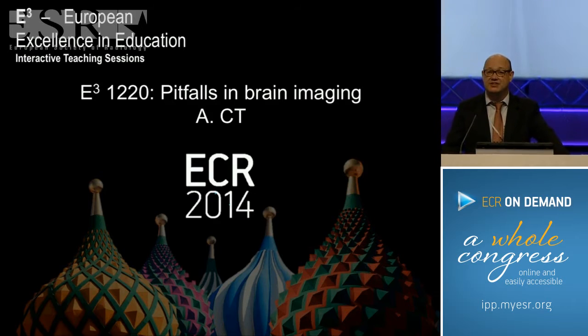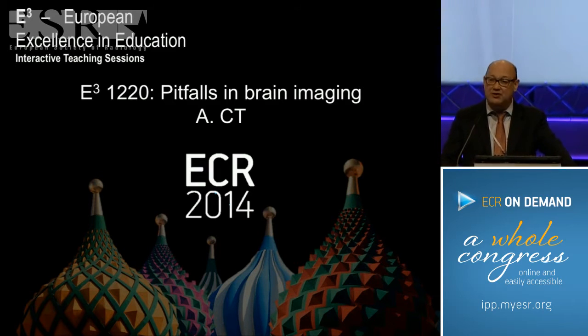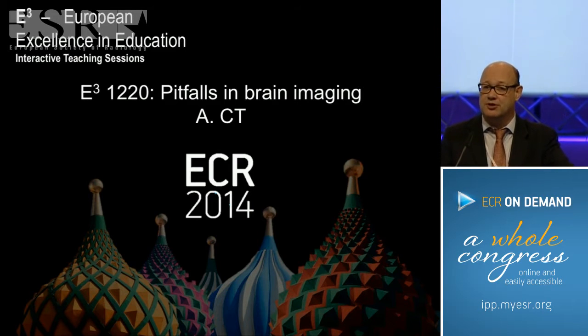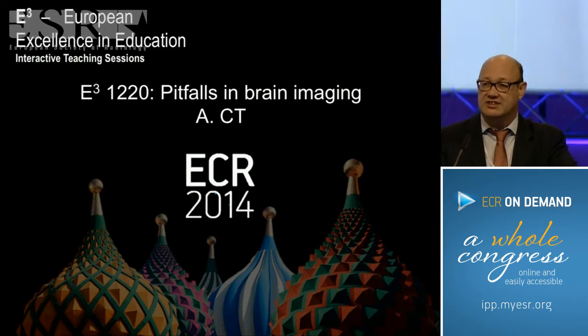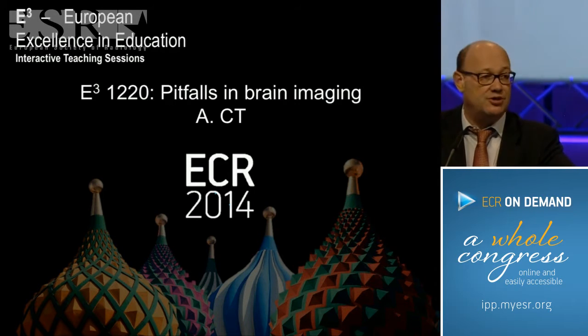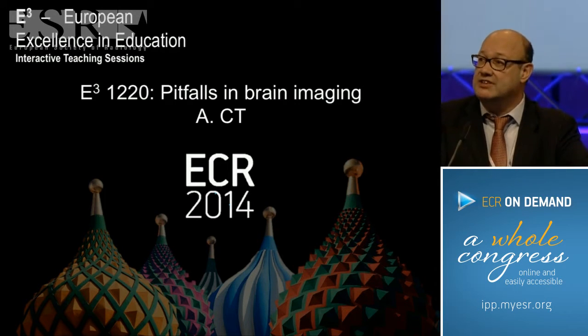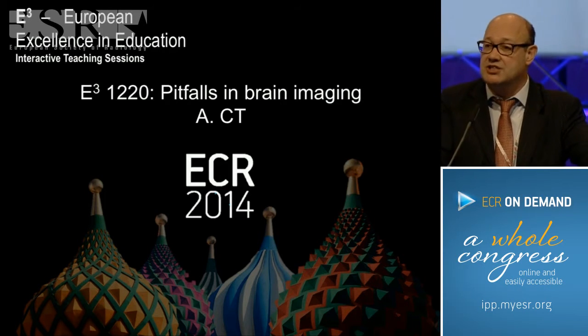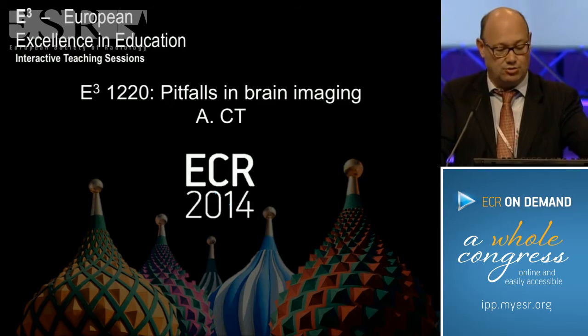This is an interactive session dedicated to pitfalls in brain imaging, and I will cover the first part of this session on CT. It is an interactive session, so please log into the system so you will be able to vote and answer the questions that we will ask you to answer.